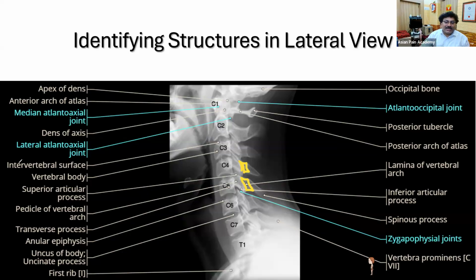And after the lamina, if we clear this side, you will be able to see a J-shaped line. Don't concentrate on the side, because if you reverse it and look from the opposite side, it will be the exact J. Here it is not exact J, because it is going to the opposite side. But these are actually known as the J lines, or it is also known as the spinolaminar lines.